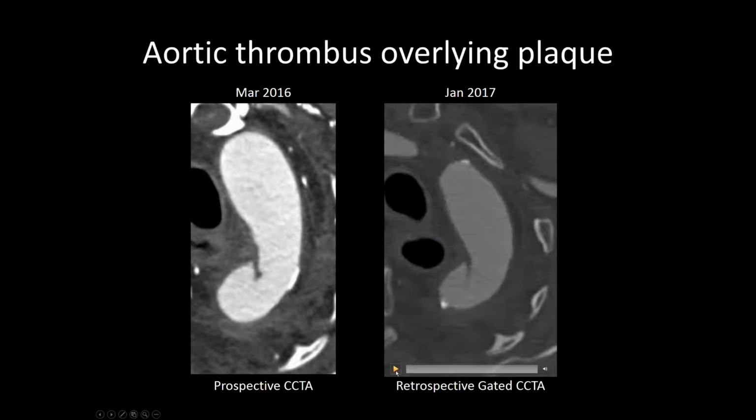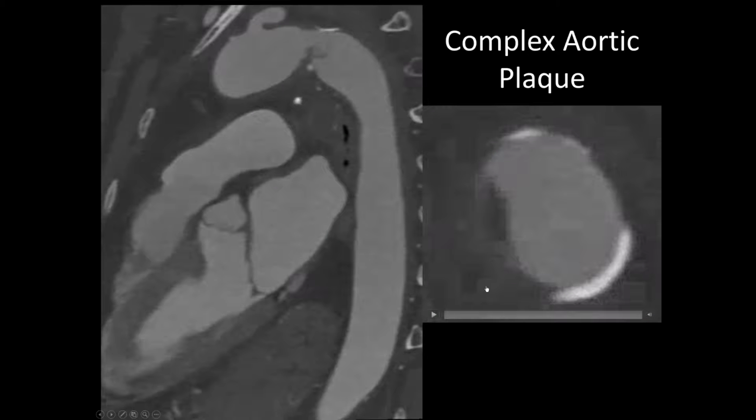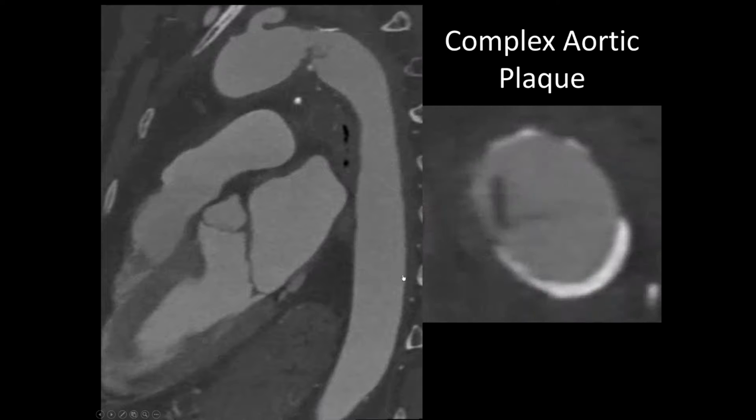Now I cannot get this movie to play again for some reason, but here it is from a different view. Anyways, you see that movie, and I'll show it to you in a different view, but I guess even this is not working. I don't know. Over to here, or... There we go. This one is working. I can switch over, but that's fine.